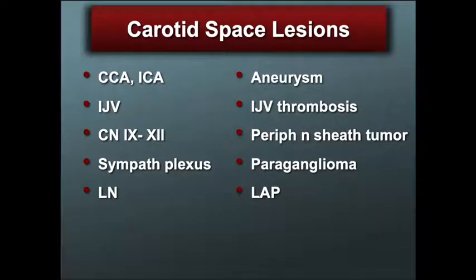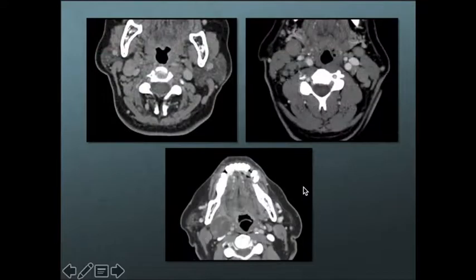All right, in addition to those tumors, of course, we can see lymphadenopathies, benign or malignant, as in the cases of lymphoma in 2 different patients, and of course, HPV positive oropharyngeal carcinoma metastasis on this one at the bottom. And sometimes they can be challenging.